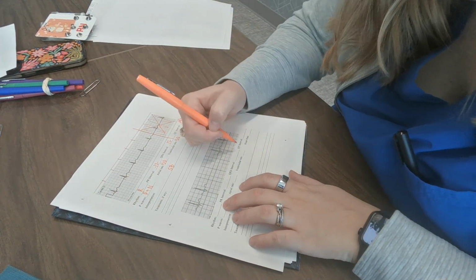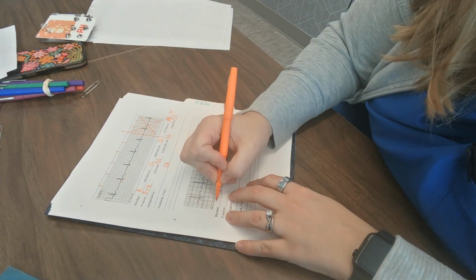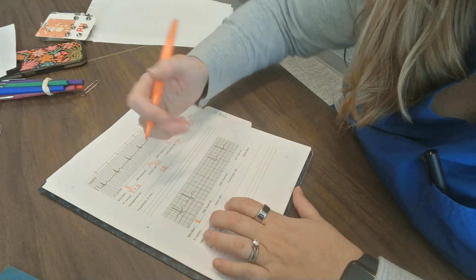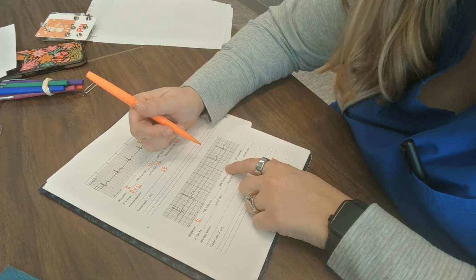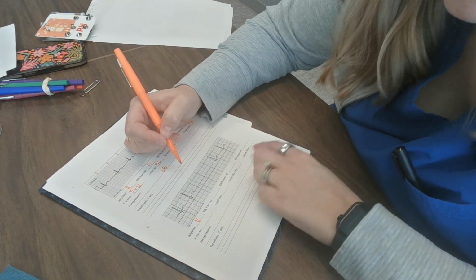Okay. So now this one, I know there was a lot of confusion about why this was regular, but it is regular, and that is because this is called a sinus pause, okay? This is not a heart block. We have not talked about heart blocks yet, so I don't want you to get that vocabulary in your head yet. This is a sinus pause, okay?